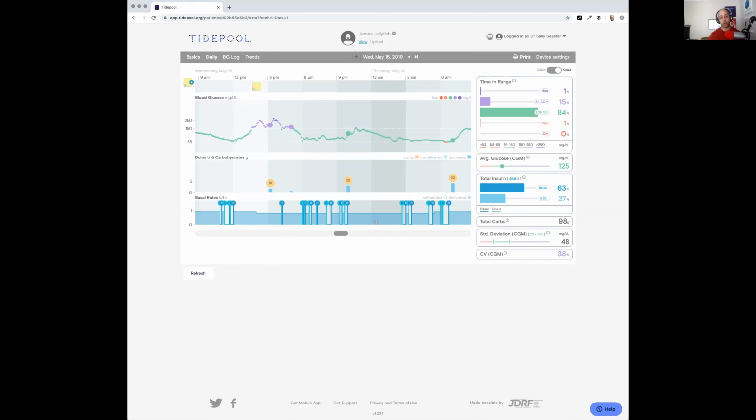So right now we don't have a concept of history. Let me bring it back here. I'm just bringing it back full screen. Hi, everybody. So we are keeping track of the settings changes whenever you're uploading your insulin pump data. We are keeping track of the settings changes on the Tidepool backend, on the Tidepool database. We're not displaying those changes currently. So there's some work to do on our end to bring back that history of things that may have changed, which would include something like your pump serial number. So if you have yet to upload your new pump, you would still have all the data from your old pump there.